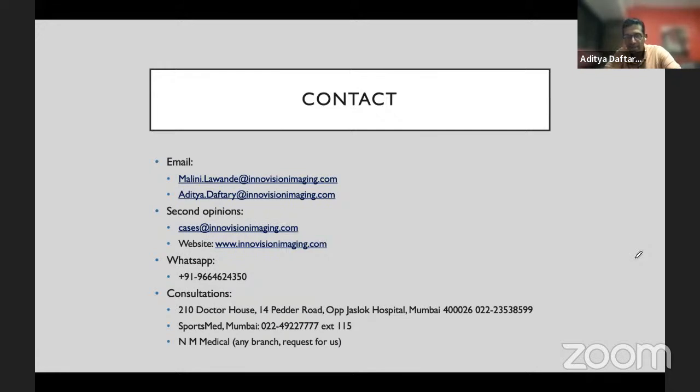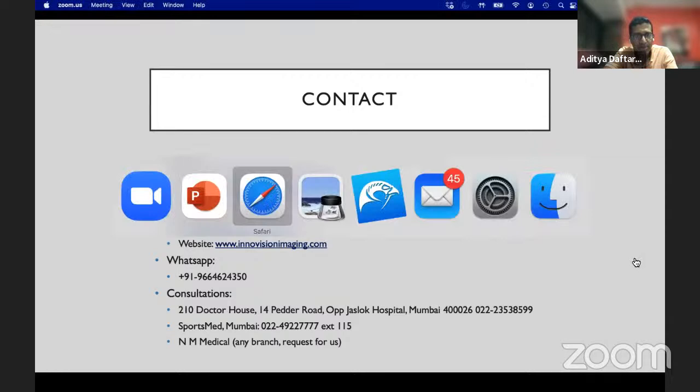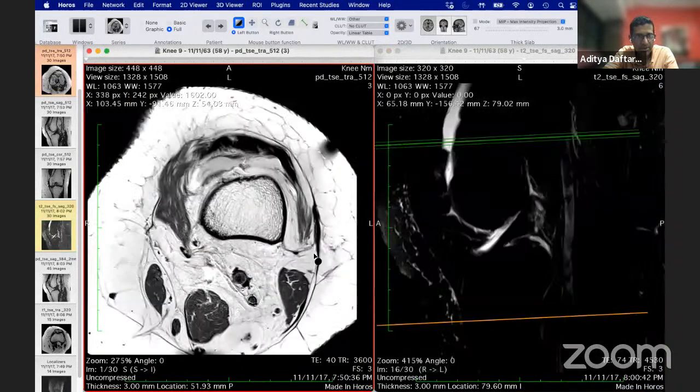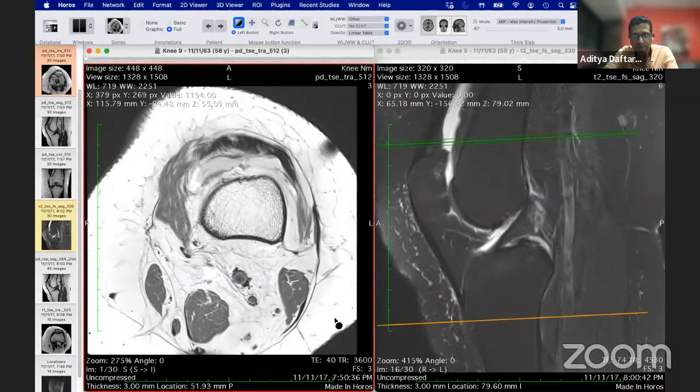Can you show where this number of TR and TE is? If you can send me a film or something like that, I can probably mark it out for you. But let me show you these images here, hopefully you can see my screen. This number here is the TE and this number here is the TR. Can you guys see this here? Hopefully you can.